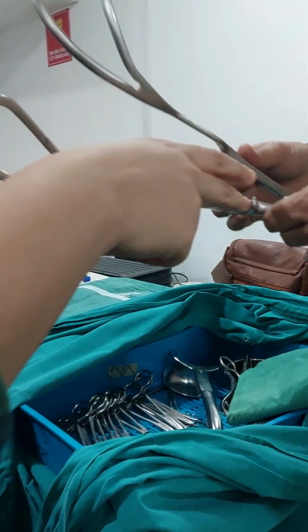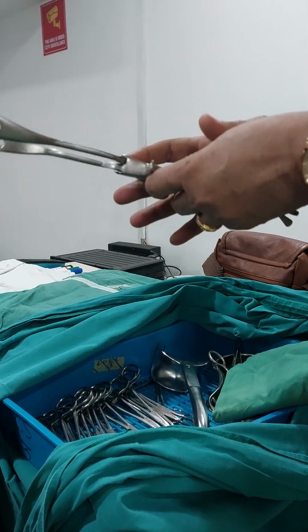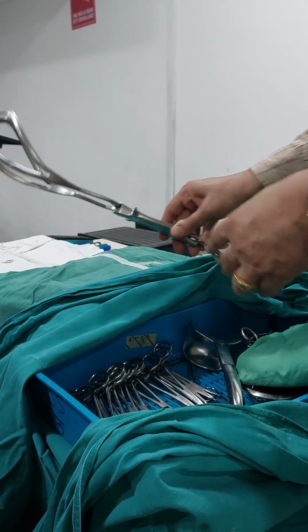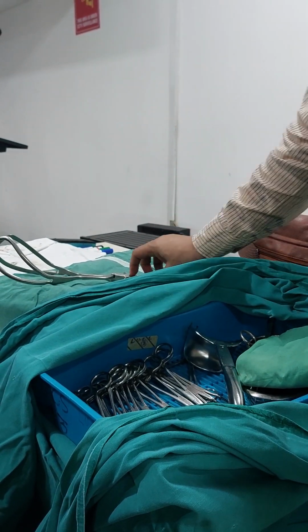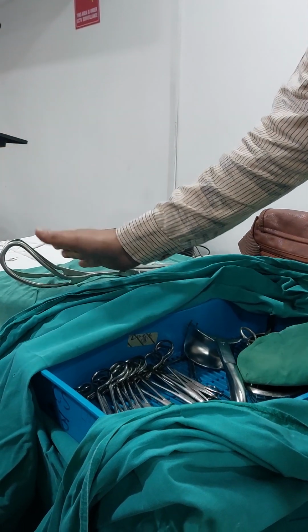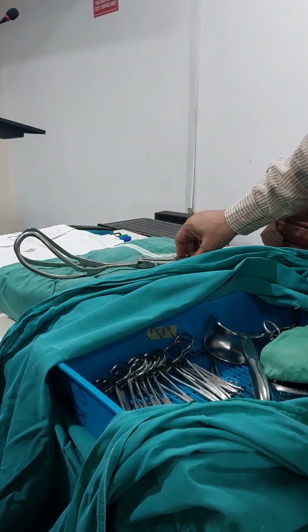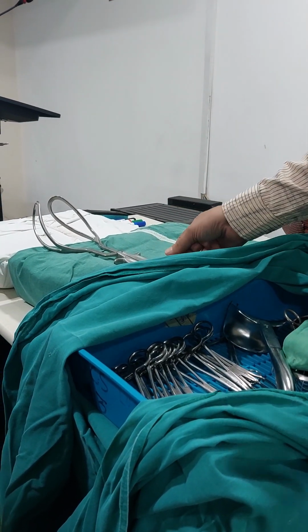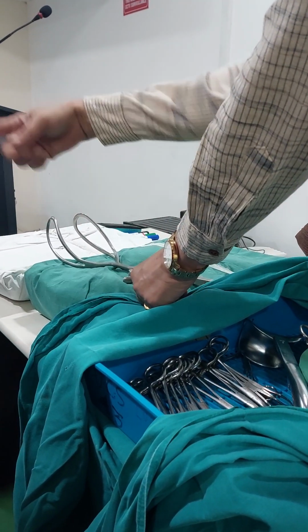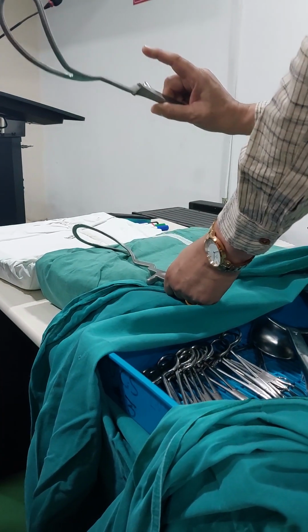First, lock the blade. This is the locking device. Put it on the table. You cannot put it like that, that is not the position. This curvature has to be anterior. That is the pelvic curvature actually. If the position is like that, then you take out this blade. This side is the mother's left side and this side is the mother's right side. And this is the left blade and this is the right blade.